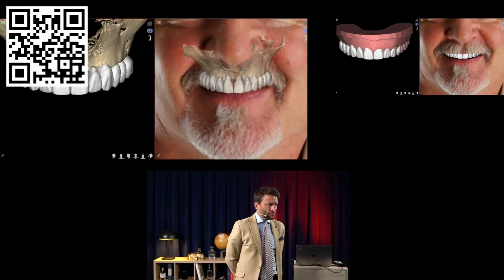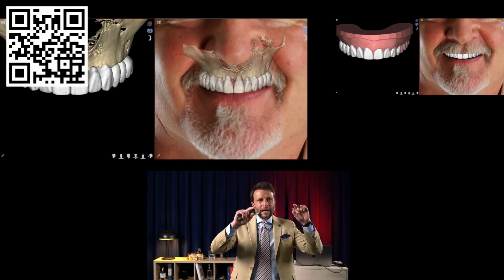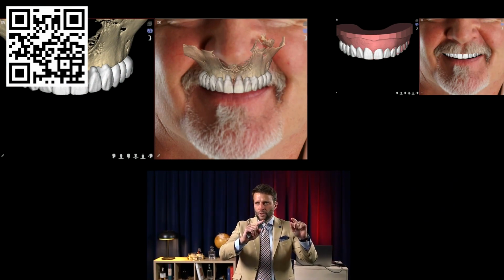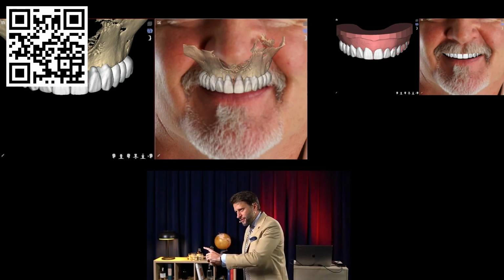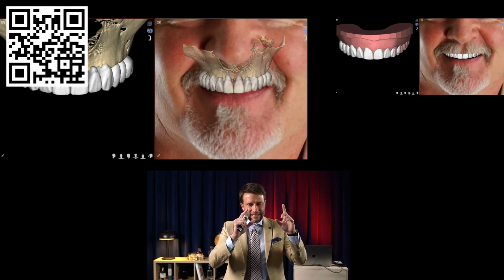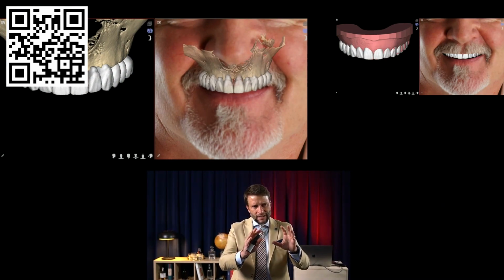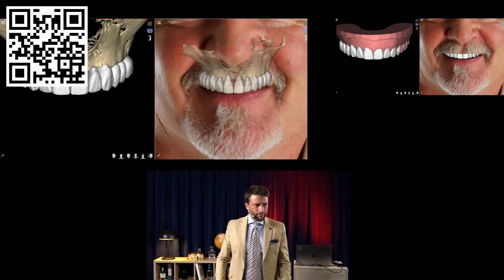But I really want to share with you what is behind 3D planning. What is behind our planning center? Because this is passion for excellence. And I hope you're going to get emotional with this case the same way I did. Patients get emotional with the motivational mock-up. I get emotional with excellence in decision making. So we have the ideal design. We overlap to the bone.